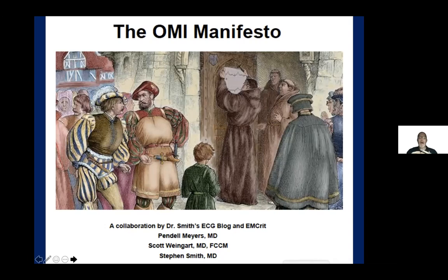If I was calling in a report to a hospital and said I'm bringing in a STEMI, it would automatically be assumed that I am looking at ST elevation on the EKG, because that is the very definition of it. That being said, it is possible to have a false positive.